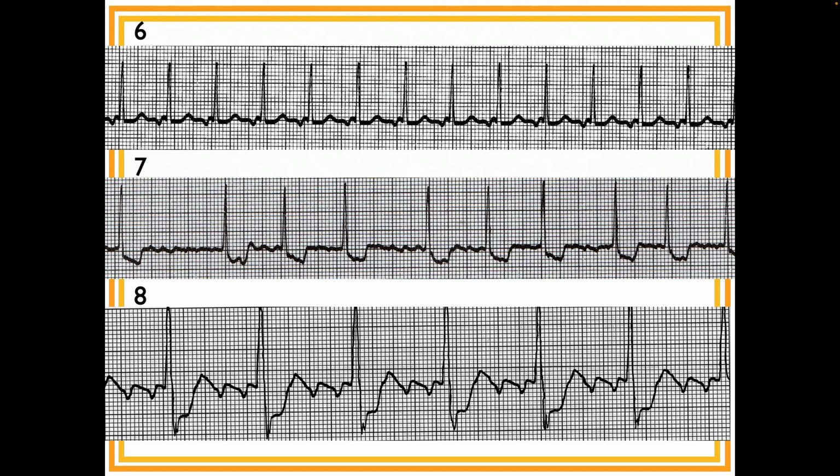The rhythm looks normal. The rate is about 70, I think. I'm having trouble with the P waves, so the QRS looks normal, so I'm thinking it's either a flutter or an accelerated junctional rhythm with a retrograde P. So, first of all, it is atrial flutter.